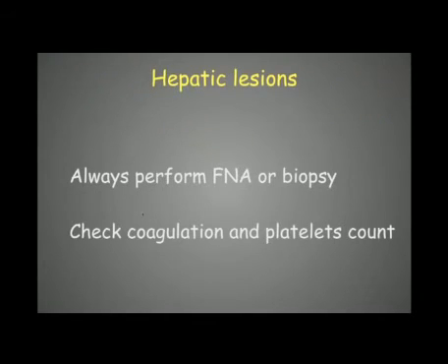So, as a conclusion for those hepatic lesions, we always have to perform fine needle aspiration or biopsies to determine the origins of those focal lesions, because on the basis of the ultrasound examination, we cannot differentiate between benign and malignant lesions. Before we do that, we have, of course, to check the coagulation and the platelet counts of those animals. And we can, of course, perform those aspirations or biopsies under ultrasound guidance.